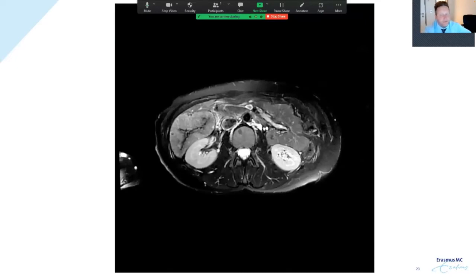This is another atypical inflammatory adenoma. However, in this case, the central isointensity, like in an atoll, has changed into black due to the bleeding with hemosiderin deposition. So the sinusoidal dilatation is in the periphery and the central isointense region has now become dark. So this is an inflammatory adenoma with bleeding.